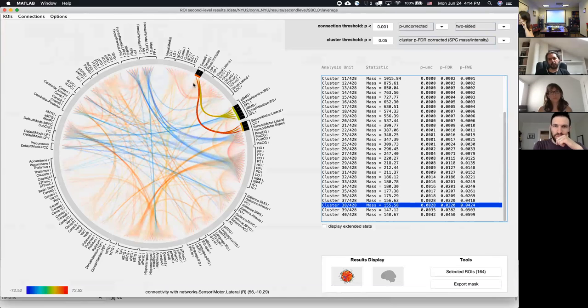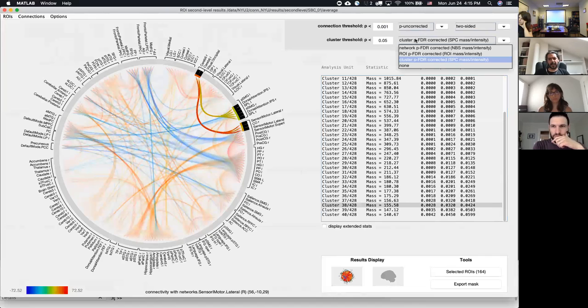So when you have these groups of connections, they are grouped because they are between regions that are relatively functionally similar. So this forms a cluster, and for that particular cluster of connections you have statistics that tell you how significant that cluster of connections is, to rule out it arising by chance. So this is how you report the results for this level of clusters of connections. And this was ROI. These are the clusters for the spatial pairwise clustering.